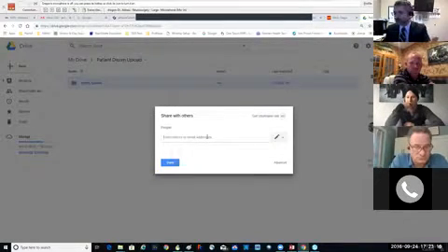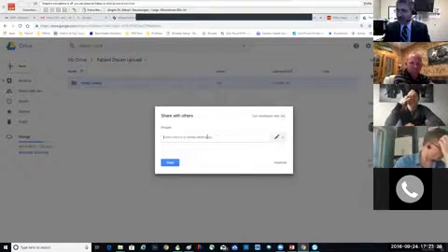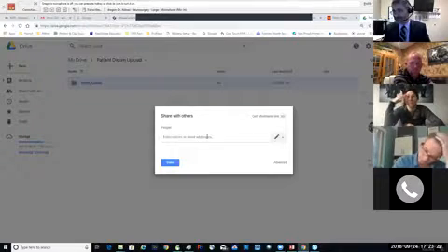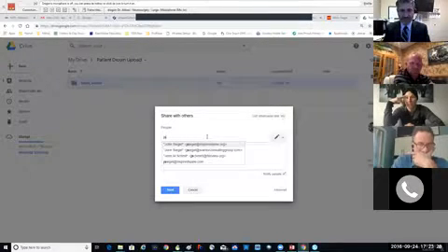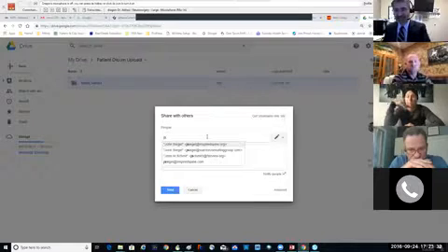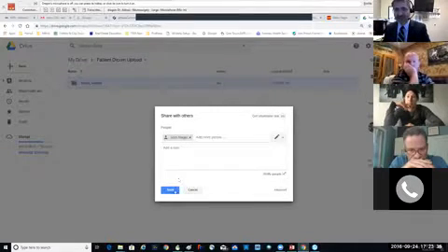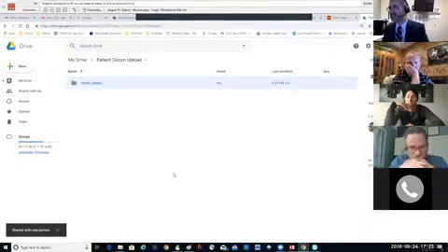Now, let's say we have an email address from Sandra. Since I don't have Sandra's email, I'm just going to share it with, for example, John Siegel. Even if John Siegel is not on Google, it's going to send a link to John Siegel. Now John Siegel can upload data to this drive.